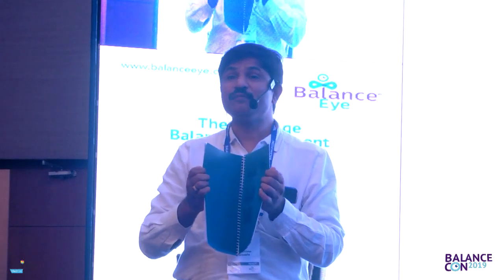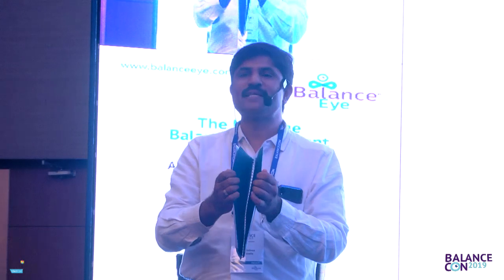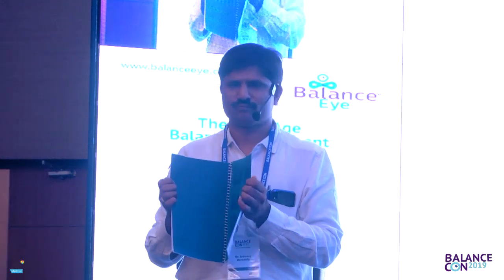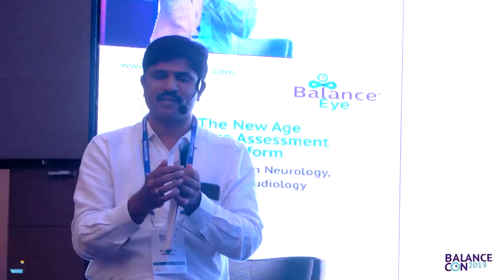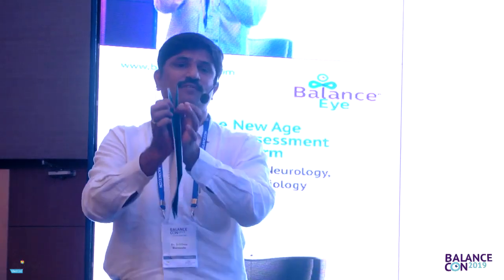So the limit for saturation is very high in the excitatory direction. From 60 action potentials per second, it can go to 200, 300, 400, 500, 1000. Whereas in the opposite direction, from 60 it can only reach 0. It won't go beyond that, irrespective of the velocity of the fluid movement.